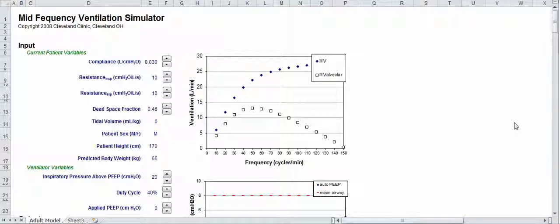With these same equations that are in the simulator, I can also use them to determine latency time and how many breaths to equilibrium if I'm using adaptive pressure control ventilation. So I'll be using this simulator to kind of go over concepts in my new courses. One's pressure control, and then also adaptive pressure control.